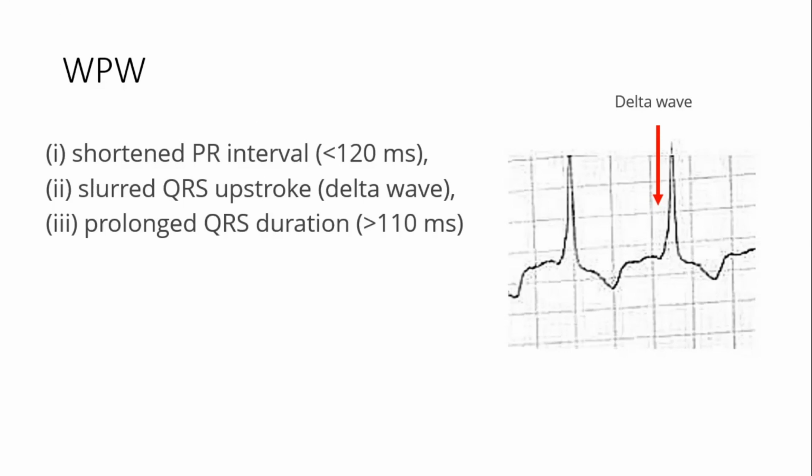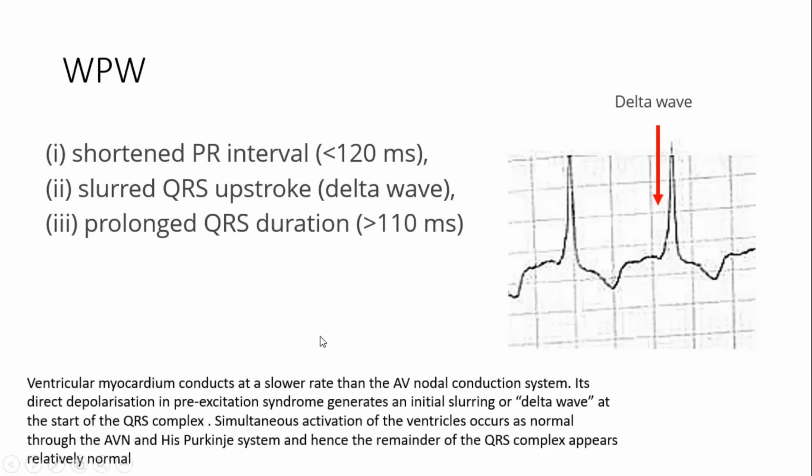Okay. Just remember now, because this is a very interesting thing. I always ask the trainees, and mostly they found it difficult. Okay, don't worry. After this, you will definitely know this. So the delta wave is formed. Always remember, you cannot stop the conduction down the node. It's just the predominance of the conduction, unless you ablate that area or give drugs.